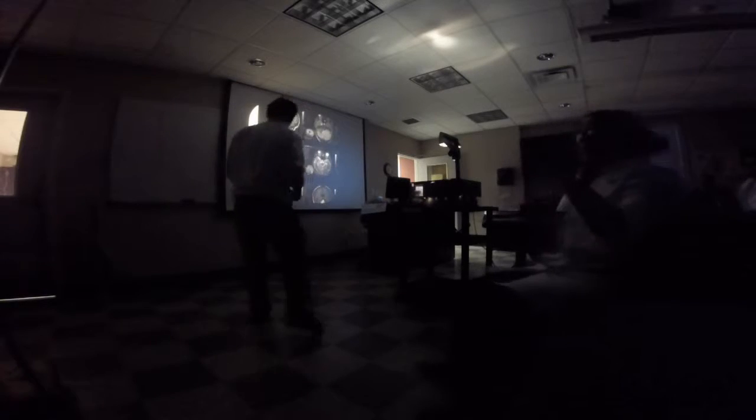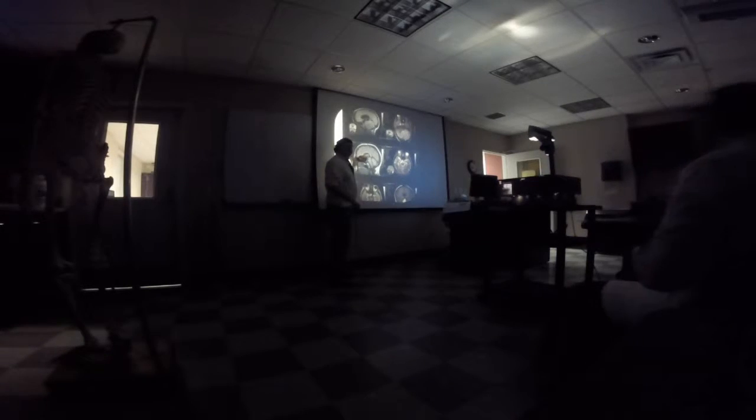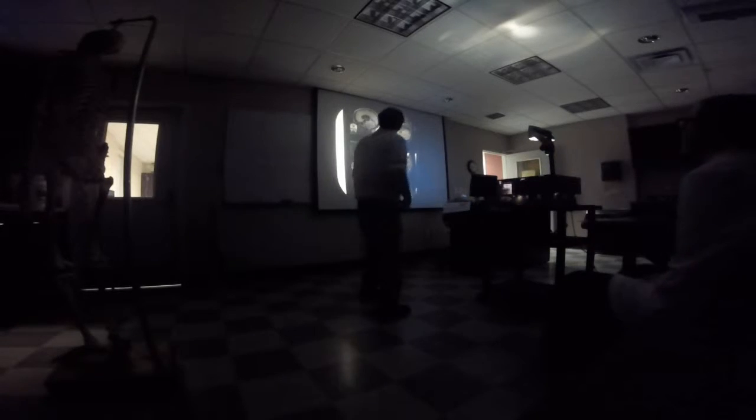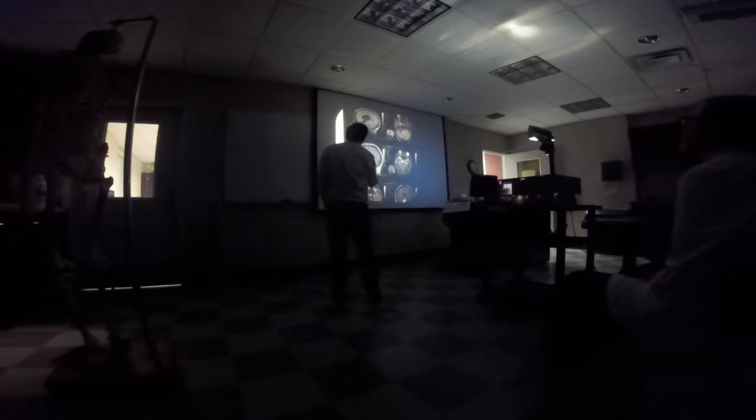Thalamus. You said thalamus. That's correct. Now, what is this little part here? This hyperdense region. What is that? What do you think that is? The intermediate mass. That's the intermediate mass. Now, what is this structure here coming above the thalamus?